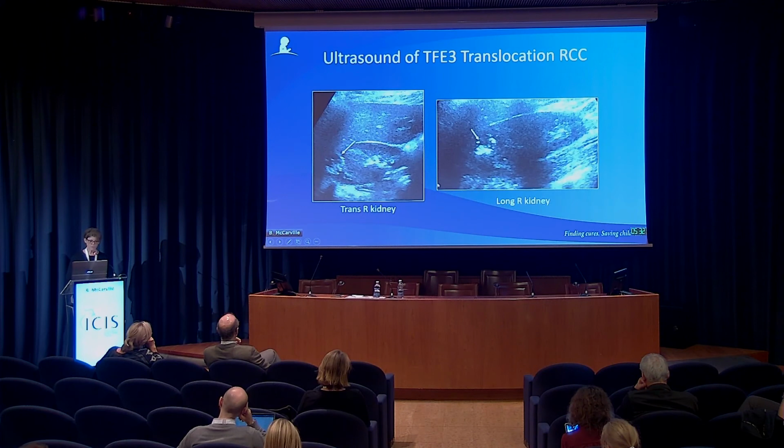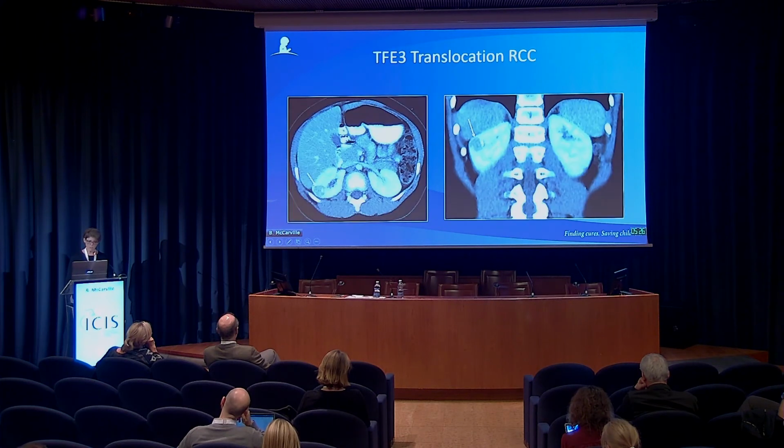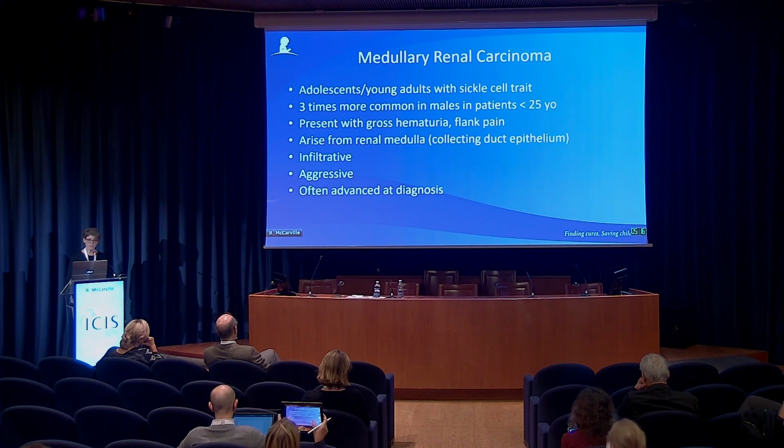This was confirmed by ultrasound. You can see the small round mass in the kidney that's containing calcification, and also by CT. So these tumors tend to be smaller. They tend to be completely contained within the kidney and often contain calcification.